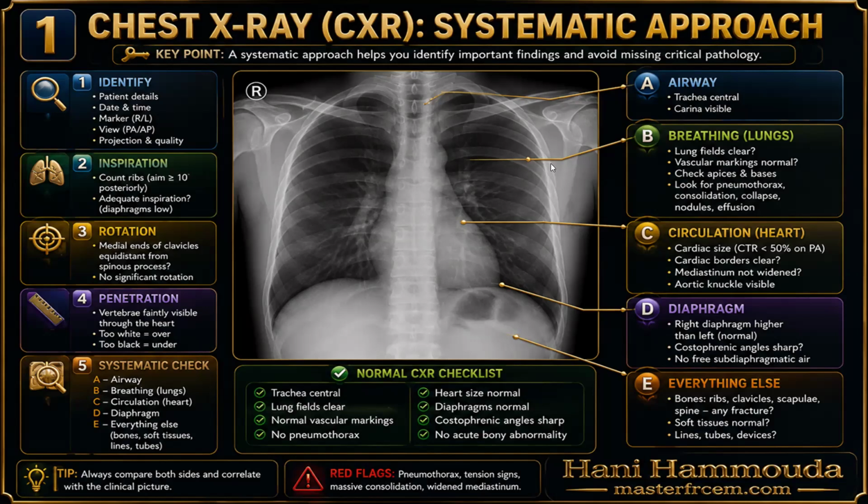Soft tissue: check for any radiolucent area, it means subcutaneous emphysema. I think it's clear now. Clear, doctor? Yes.